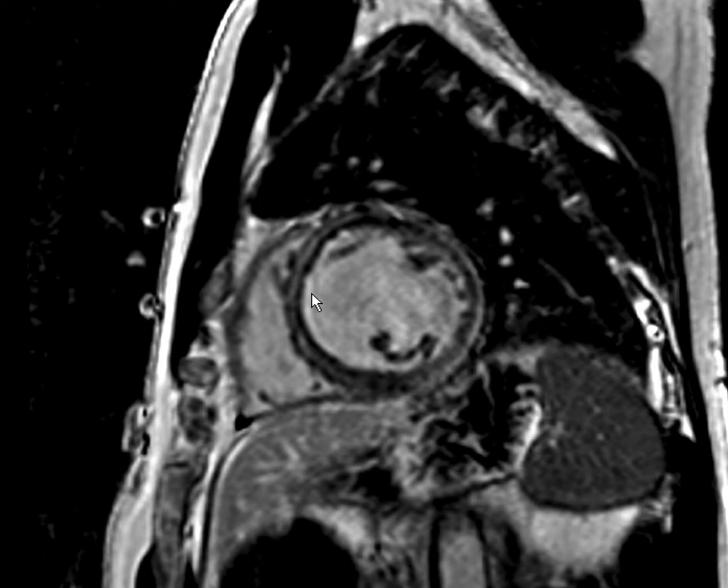An ischemic cause would present in late enhancement as subendocardial or subendocardial to transmural, because the subendocardium is the most vulnerable part. Therefore, whenever there is coronary artery disease or a coronary artery event, the subendocardium is first to be affected.